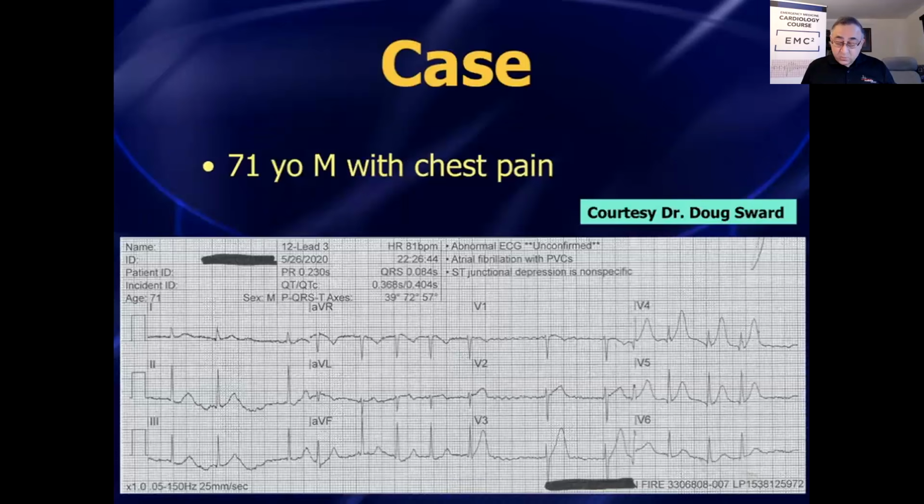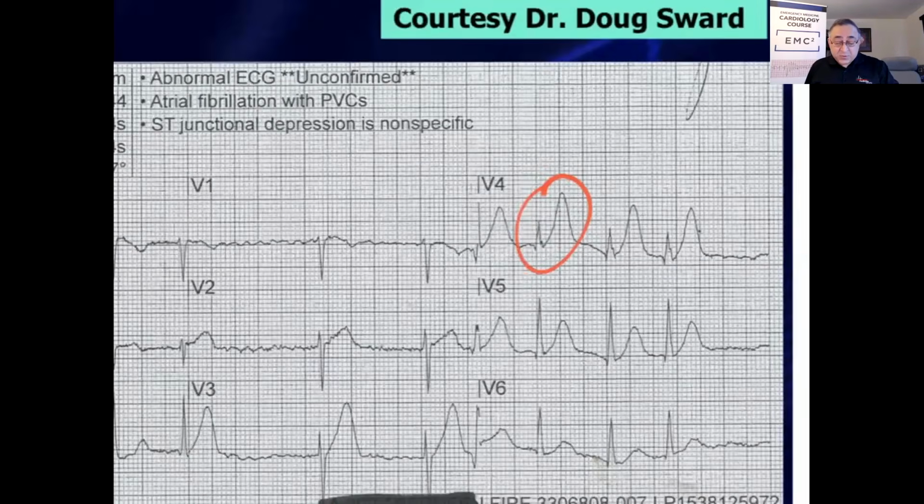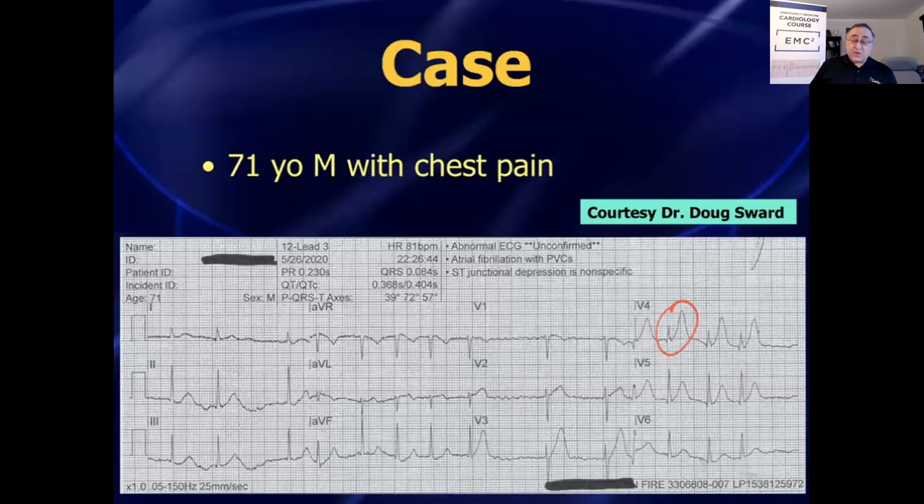Anything? Well, hopefully people are saying V4. Take a look. You've got that disproportion. That's what Doug was worried about in this case. So he repeated the 12 lead.